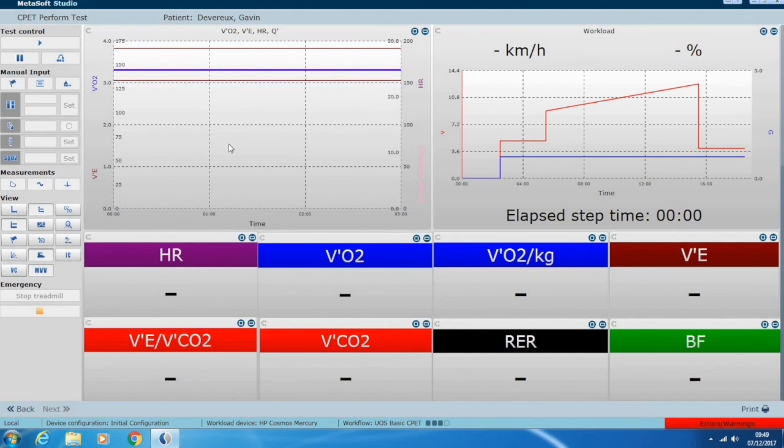So there you go. It's all been made efficient, hopefully, for you. There are no superfluous menus to go through for this particular module's assessment. And like I say, have reasons, have answers, or just discuss why you might have chosen a particular protocol. We can help you if you forget the particular button order of clicking. That's not all that important. Those things change over time anyway, and everyone has to learn new software.